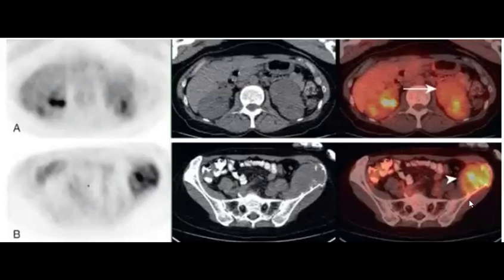Yeah, renal to bone. What is the something that sometimes makes you confused here? That the uptake here, is it higher than the primary tumor or lower than the primary tumor? Do you see the uptake in the metastasis? Is it higher than the primary tumor or lower? Yeah, it's higher than the primary tumor. So sometimes it's tricky and confusing. Is it the primary or not?